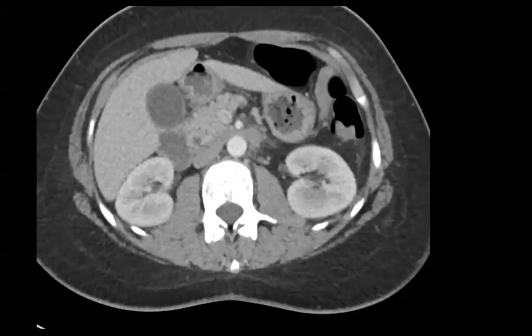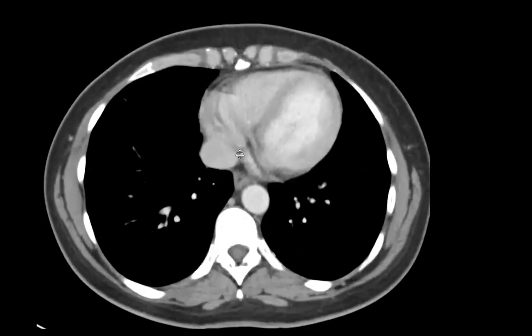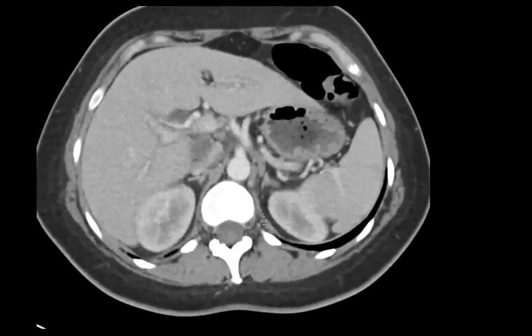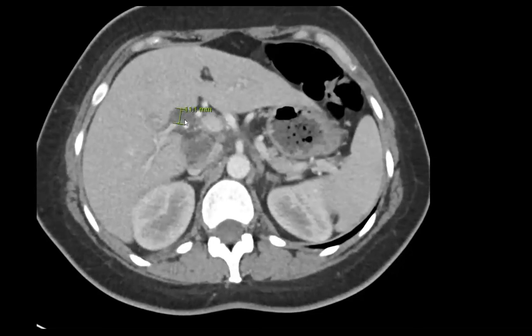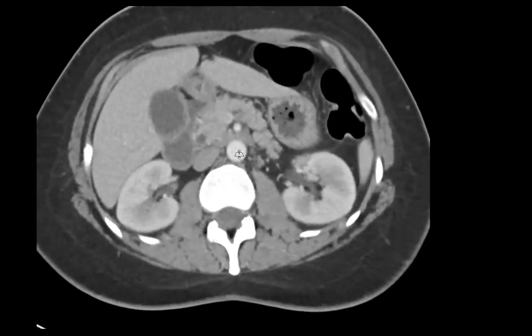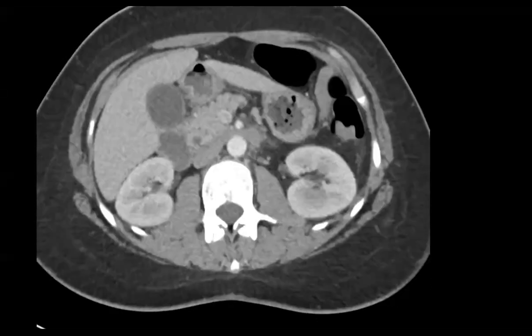Nice. So this is a 39-year-old female presenting with right upper quadrant pain. We started with a CT from the ED, which did not show any cholecystitis, but the CBD was a little bit dilated. It's 11 millimeters, and she has her gallbladder in place. She doesn't have any hyperdense CBD stones, so we got an ultrasound.